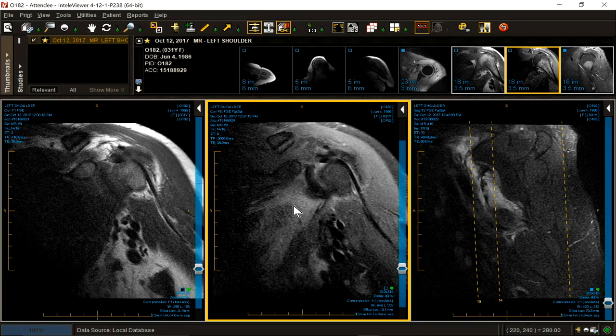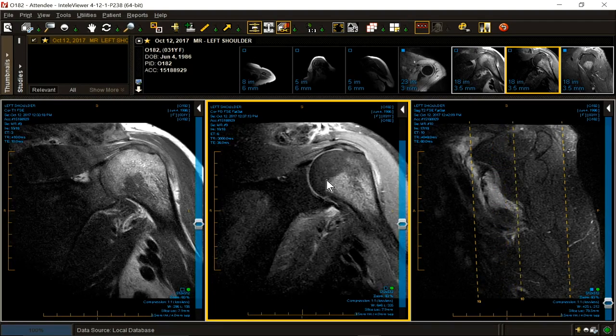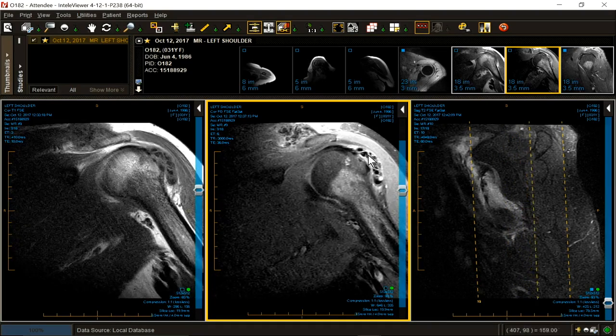So the patient has severe, constant, sharp pain over a year, and there's another piece of history I've withheld. She's in renal failure and on dialysis. This is what's known as mineralizing arthropathy of the shoulder with amyloid. So you finally got to see one. Without that history, it'd be a challenge. Now, what is actually chemically in here? This is a subset of HAD, hydroxyapatite deposition. Calcium, phosphorus, and amyloid tissue. The history was critical. All right, let's move on.